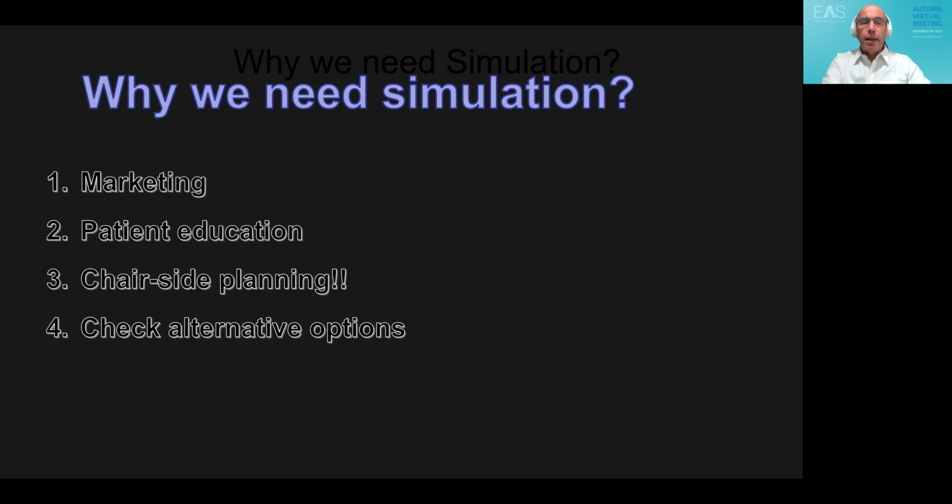We can check alternative options. Many times I do 2 or 3 simulations for the same patient, one with extraction, one with IPR, and another one with anterior posterior change, for example, for surgery or for class 2 mandibular advancement treatment.